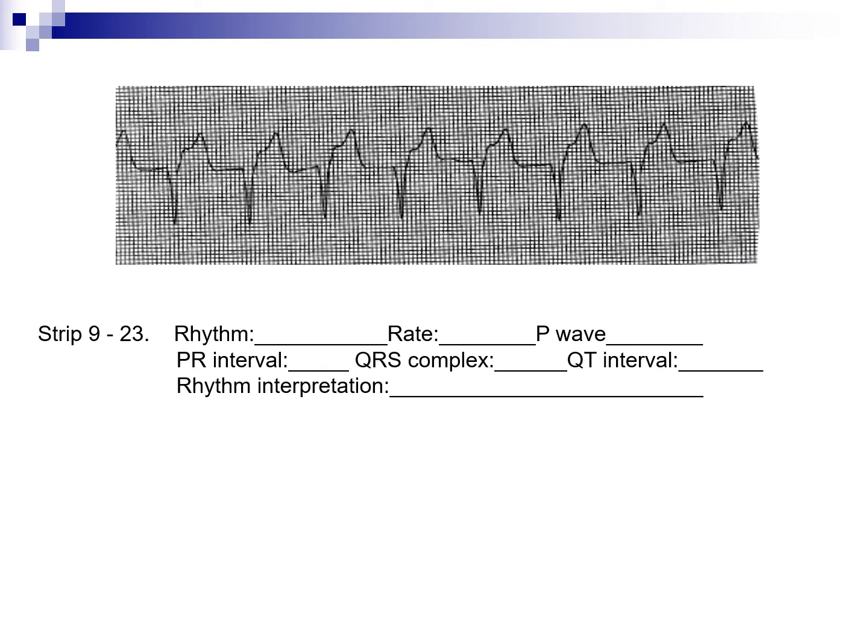So we are going to interpret this rhythm as it's wide, so it's coming from the ventricles, but it's faster than an idioventricular rhythm, so therefore we call it accelerated IVR. So anytime you have a rhythm that's greater than 40, between 40 and 100, we call that an accelerated IVR or AIVR. These patients sometimes can maintain their blood pressure adequately because of the faster heart rate, but most times they are transient, such as in a reperfusion of an MI.